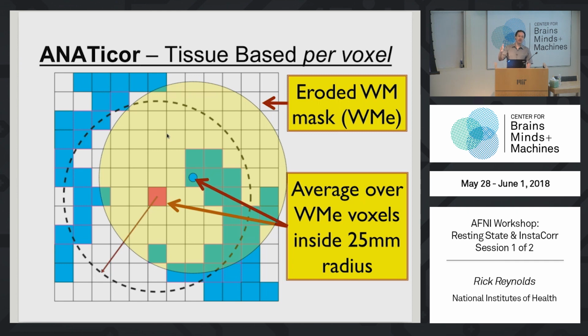In some sense, you might want the closer white matter to be removed preferentially over far white matter, right? So this mask, if you picture it as a disk, you're going to take an average of the local white matter. It's flat, it's unit height.